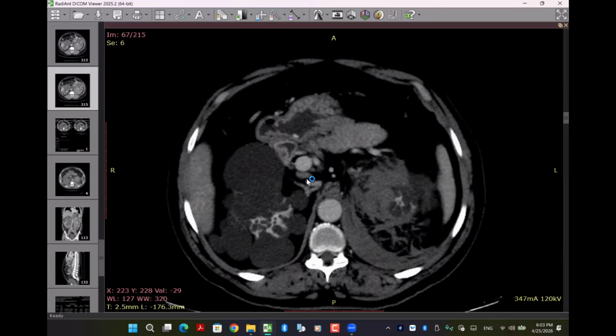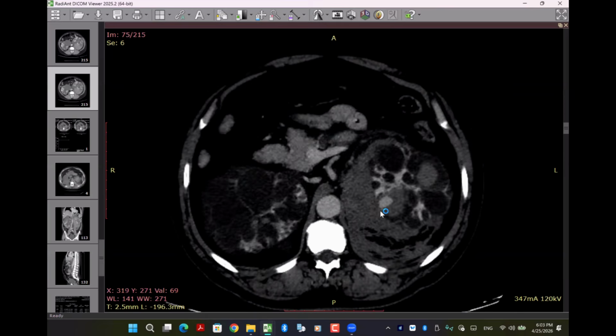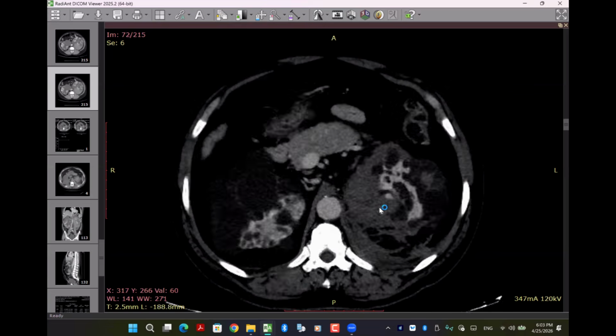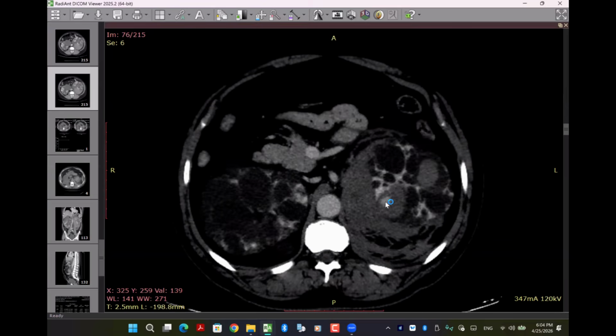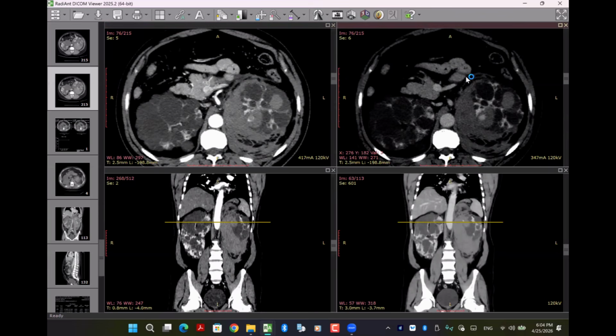Actually, if we are searching for any active contrast extravasation inside any study, even for trauma cases or for something like polycystic renal disease, we should compare the 2 phases. If we see any focus with continuous contrast filling, like this one and that one, we should consider that this patient has active extravasation of the contrast. You got my point? See, you can see this point.